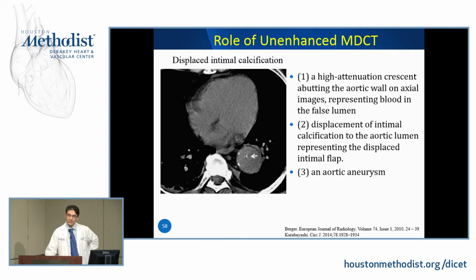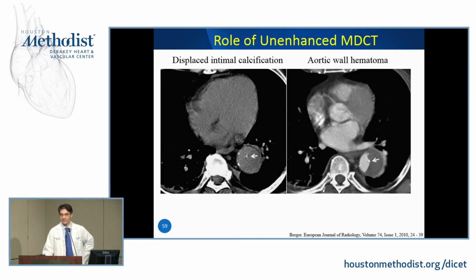Non-contrast CT can help you with dissections, believe it or not. The intimal calcium gets displaced into the middle of the artery, and we can see that very nicely with a non-contrast scan. And here's the corresponding CT scan showing you the pathology.